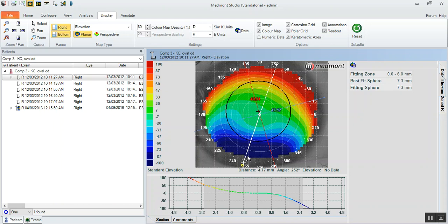However, when the elevation difference is under 350, in other words, when the asymmetry of the eye is low enough that we're under 350 microns of height change, that's where a corneal GP can be successful around 88% of the time. Now in this case, the eye comes up 300 microns of elevation change, so we should try a corneal GP.